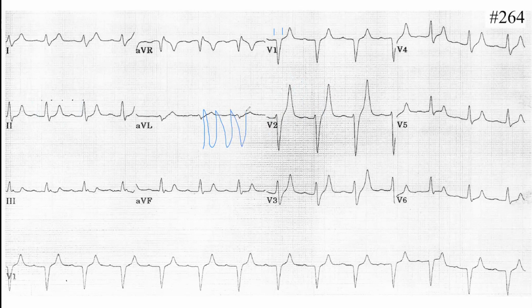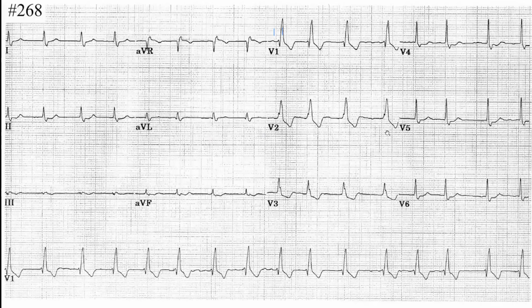And whatever the ECG gives, the diagnosis is that the rate is about double. However, this is a QRS complex, that's a T wave. That's a QRS complex, that's a T wave. So sometimes the T looks similar to the QRS complex because the QRS is elongating. Okay, good, very good. All right, let's move on. Yes, we already had this. Okay, let's have this one.